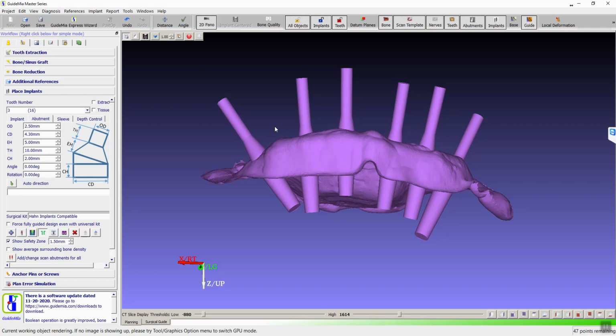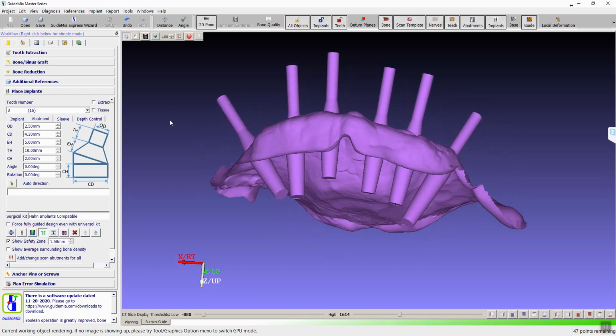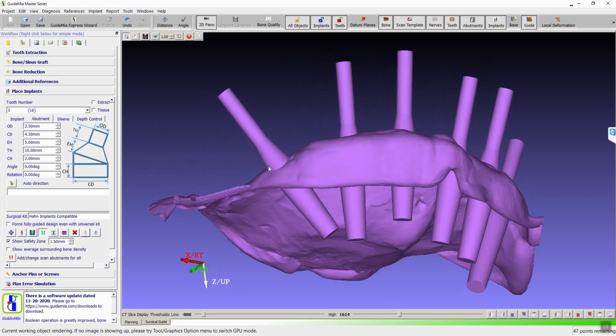All right, I need to get you the STLs for all our new scan abutments. Could you send me a quick note on where you want the zero point? I suppose you want it right at the... The origin point will be the same as the implant. So that when they are placed together, the origin points overlap? Yes, the origin is at the implant origin. Okay, perfect.